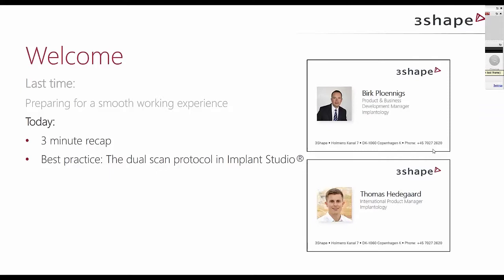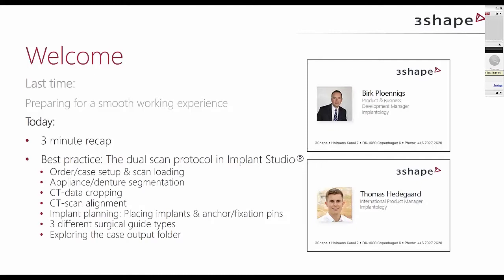So we're going to recap, and then we're going to look at the best practice on how to prepare the dual scan protocol for Implant Studio. Yeah, exactly. And here we're going to try and cover some different aspects of the software. It's basically just some tips and tricks. We're not going to go through entire cases. We're just going to sample a little bit in what we have seen as tips and tricks coming in for these dual scan edentulous cases in Implant Studio.